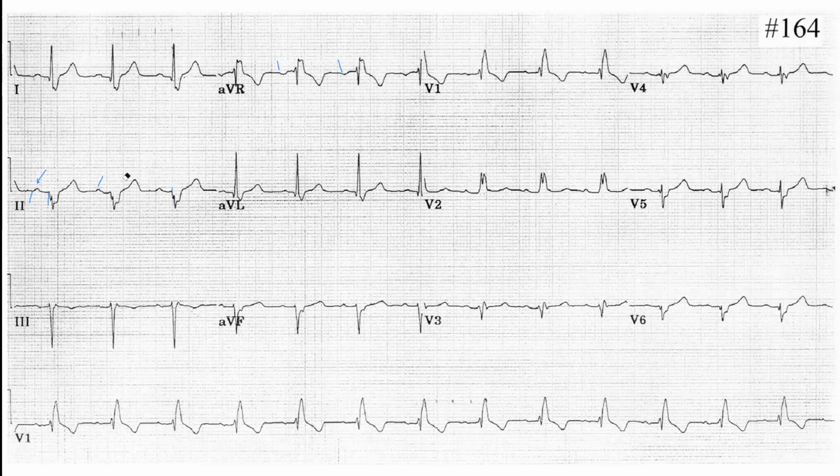All right. Next one, QRS. Is it wide? Yes, we do have a wide QRS complex. So what does it indicate? It means that the conduction in the ventricle is abnormal, through the ventricular muscle. Which one? You have to compare these two. I explained before. Can you see the wide R wave? It means it's at the right side. So it would be the right bundle branch block. Exactly, that's a right bundle branch block.